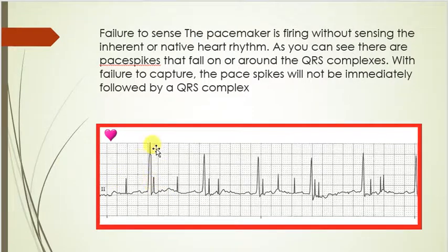So this one right here, obviously this is an AFib, it looks like to me, the underlying rhythm, but it's not sensing anything here. It's just firing all over the place. Look at that, it's just firing here and firing here. Basically the patient's doing his own thing, and he's probably fine, but the pacemaker is trying to tell him, oh, fire here, and it's obviously not picking up anything.